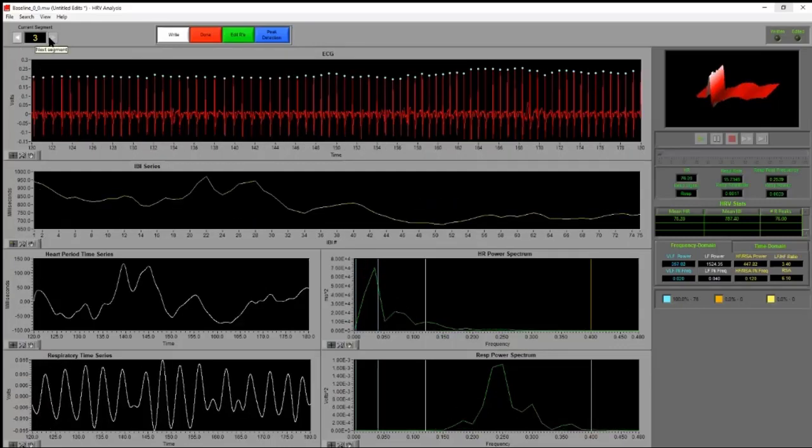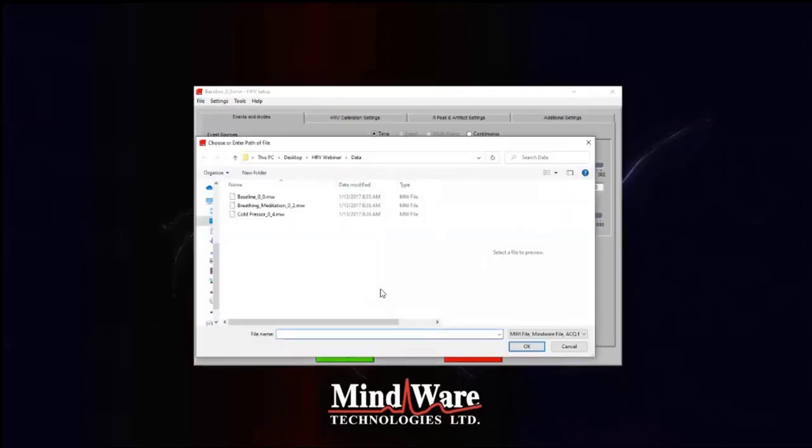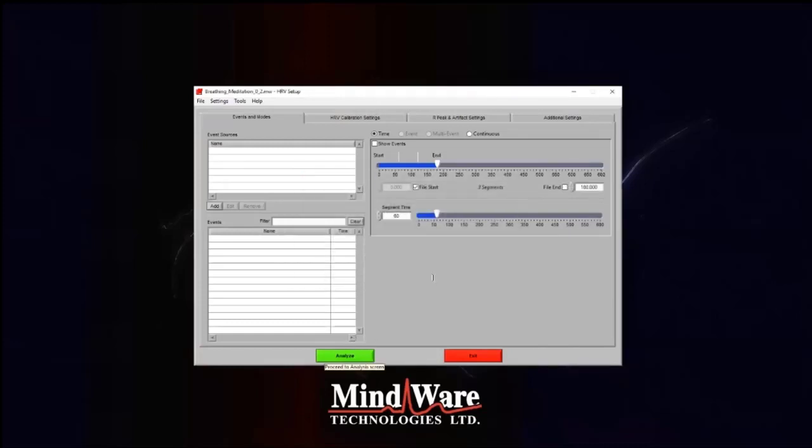Okay, so I think the rest of this is clean. So I just wanted to show you that baseline. And then we'll go ahead and open the different files. Again, this is the same participant, but just different conditions within there. Most studies will organize this into one file that, again, has these event markers within there. But in this case, we have separate sessions. Okay, so we're going to jump right back into this.